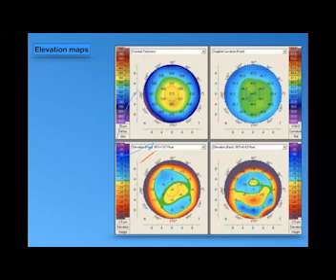If it's curvature hyperopia, not axial hyperopia, there is a program calculating and treating that in all machines. Most machines calculate the elevation maps for the hyperopic patients, especially in the display of the Belin-Ambrosio. You may find a point for the myopic and another calculation for the hyperopic. But actually the posterior elevation points in hyperopia are like the myopia, but it is the margin of suspicion.